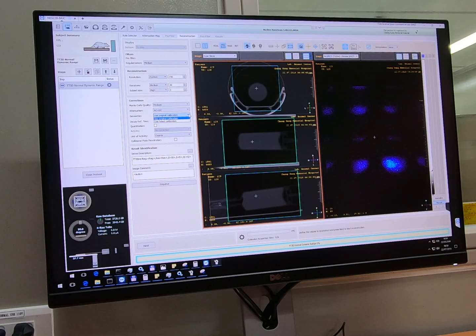The geometrical calibration, so there are 2 options: either original or the latest. For now it doesn't matter because it's the same, but you might need to reconstruct data from last year with a new geometrical calibration, and you might realize at some time point that the latest is better than the original one, so there is a possibility to choose between them.